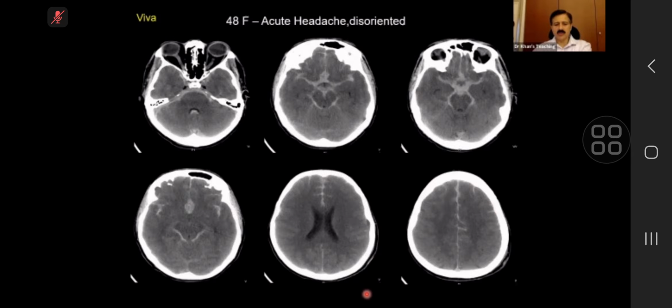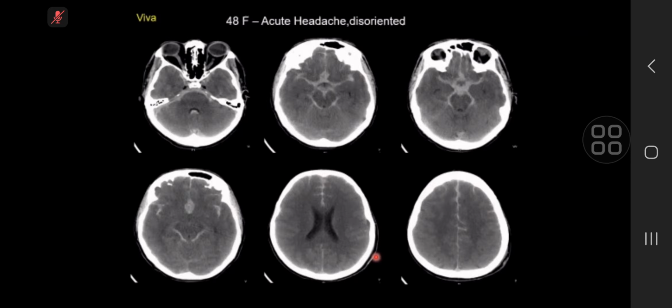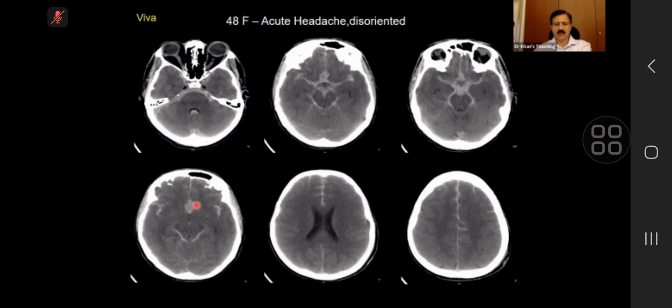So anatomy-wise, where is this aneurysm sitting? So this will be in the basilar tip. This is not, you see, this is the territory of ACOM. Yeah, apologies. ACOM, right? This is a classical exam case, and they will ask you what is the cause. When there is a thrombus sitting at this, you just say that this is in keeping with ACOM. Of course, you would like to confirm it. That's a second thing.